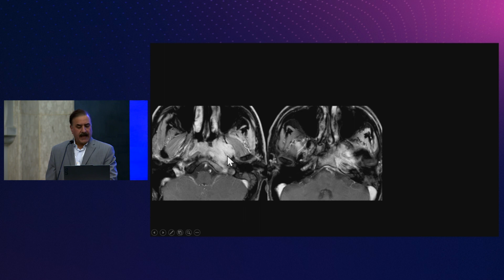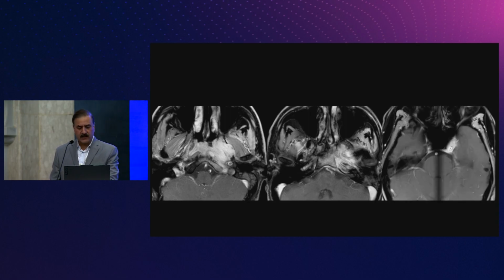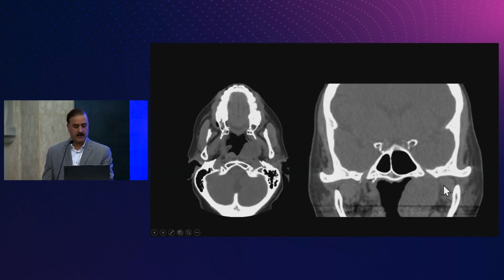Straightforward nasopharyngeal cancer. One of the things that it does is that it creeps along the petroclival groove. That's really almost like a potential space for cancer to go up, and it has gone up and then infiltrated the cavernous sinus, and you can see now it's circumferentially around the carotid artery, so there is complete infiltration of the cavernous sinus, intracranial extension, so that is again a T4 disease based off of that.